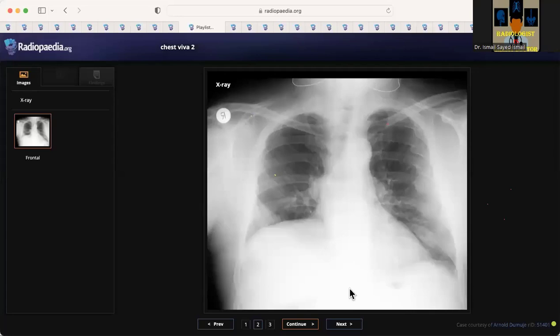On the left hemidiaphragm, I can see that there is loss of continuity of the medial aspect of the left hemidiaphragm. So that will be concerning for a retrocardiac or left lower lobe opacity. In my routine practice, I will window this a little bit more to see if there is any retrocardiac region, and correlate this with the patient's symptoms. If there is any lateral radiograph, I can take a look at that.